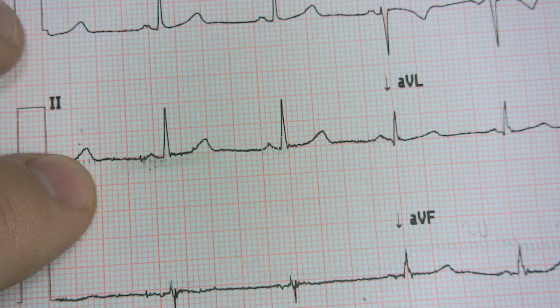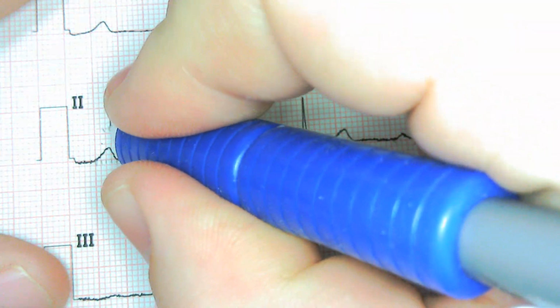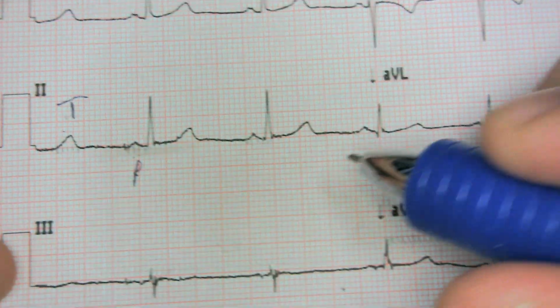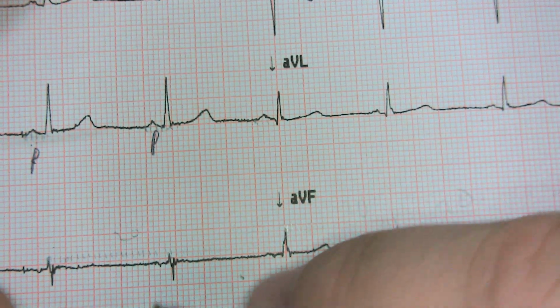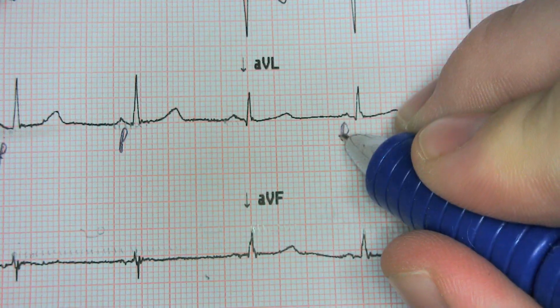A lot of people say, oh, this is a P wave, it's the first thing I see. No, that is not actually a P wave. So this right here is a T wave. Make sure that you know what your waves are. So for example, here's a P wave, here's a P wave, right? And so all these P waves look pretty much the same. Now, if you look over here, well, no, it does not look the same.